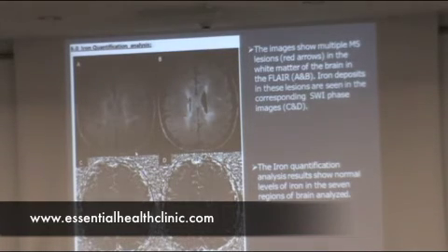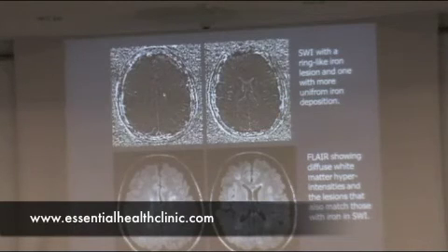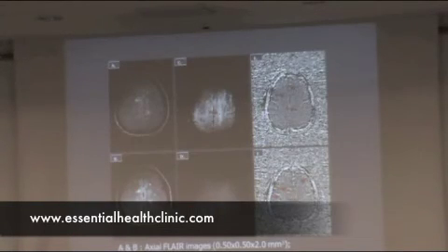But not all lesions have iron in them. According to Adams, who did some cadaver brain studies in the 1980s, only about 20 to 30% of lesions have iron in them. And some people may have lesions that have no iron at all. Others may show, as in this example, iron, again, another Dawson finger example, iron here, lesions in here and here. Here is an individual that shows iron at this point more distributed and yet iron in a ring-like structure. And here's a third individual whose all the lesions look like ring-like structures. And so these are called type 2 and type 3 MS lesions. And they can be very different from one MS patient to another. So clearly there's something different going on there.